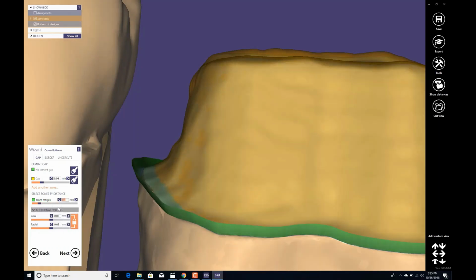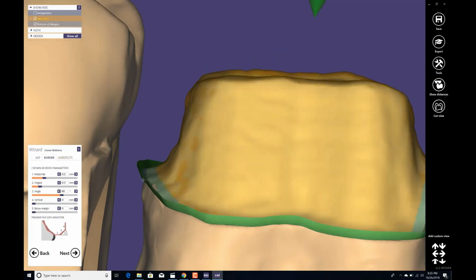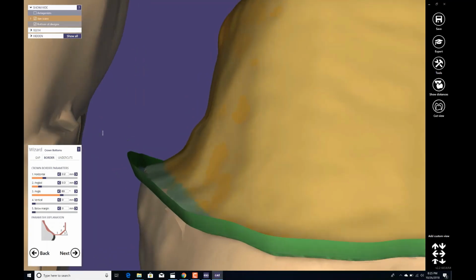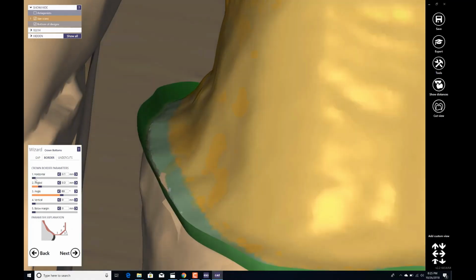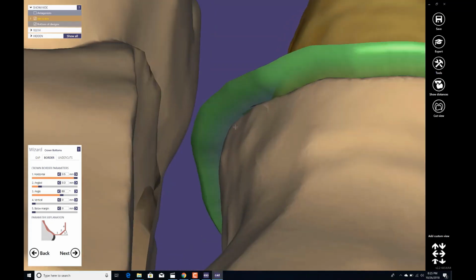we say we want to keep at 0.04. Here nothing, because it's a single unit, full contour in zirconia. Horizontal. What is horizontal? The horizontal is this layer right here. Okay, as you can see, I'm gonna change it so you can understand what is this. Is exactly the part right here.